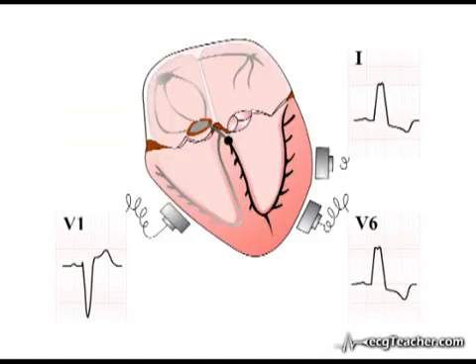The complete lack of concordance between QRS complexes and T waves in left bundle branch block should also be emphasized. In left bundle branch block, this is expected. The grossly abnormal pattern of depolarization produces secondary abnormalities of repolarization, with ST elevation or depression in various leads, and complete loss of concordance between QRS complexes and T waves across all leads. These changes are an electrical phenomenon secondary to the highly abnormal pattern of ventricular depolarization and do not indicate underlying acute ischemia or infarction. Block on an ECG is a highly abnormal finding.